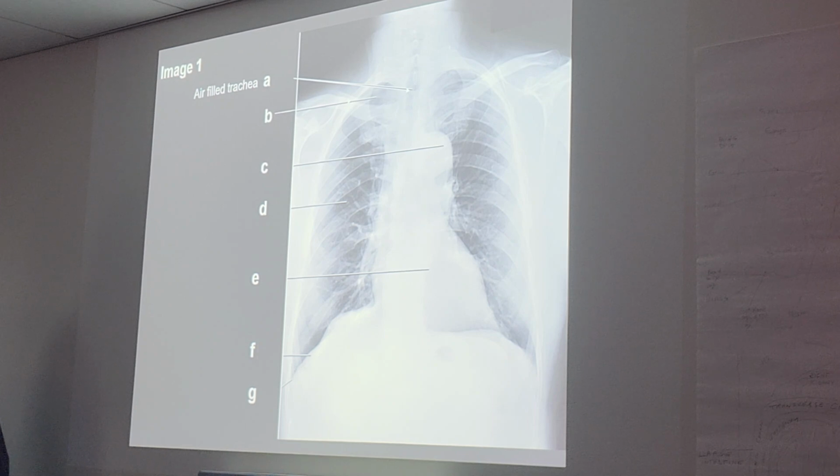Apex. Apex is the right. Okay, right apex. Good job. C. What's up? You're too busy texting over there. There's a lock on my phone. C is the aortic notch. Okay. Aortic arch, I like that.